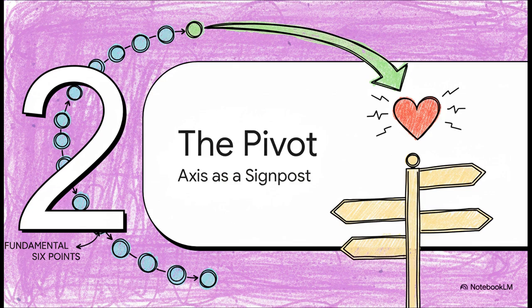So now that we've got the foundational stuff down, we've come to a critical juncture. Determining the heart's electrical axis isn't just another step in the process. It is the single most important pivot point that's going to direct the entire rest of our diagnostic pathway.